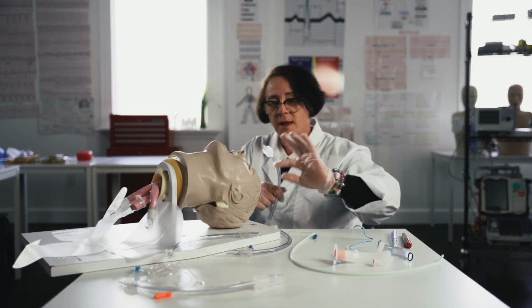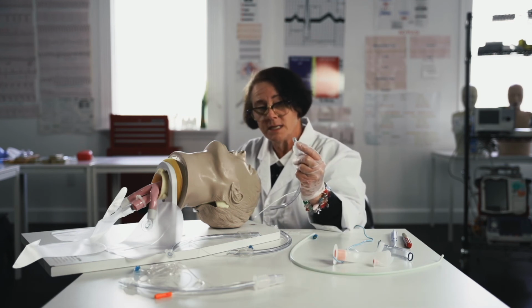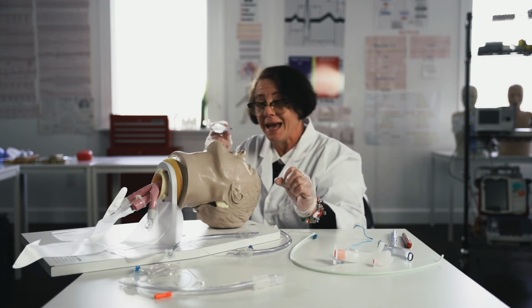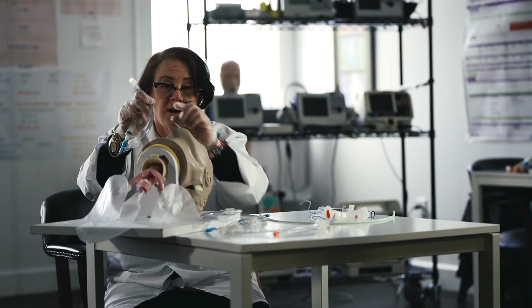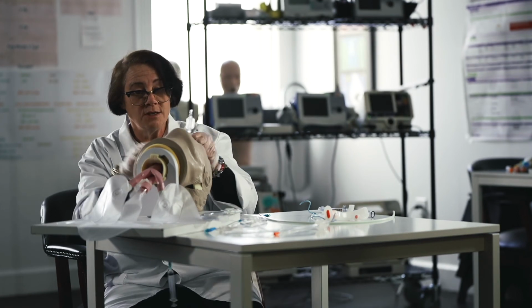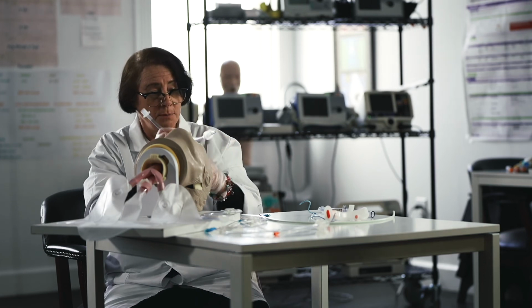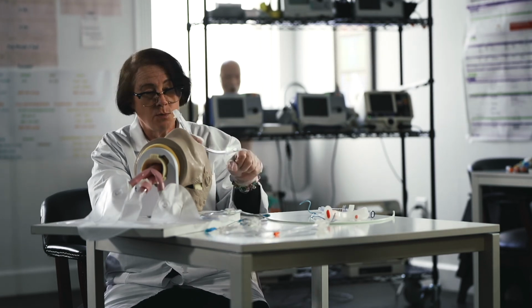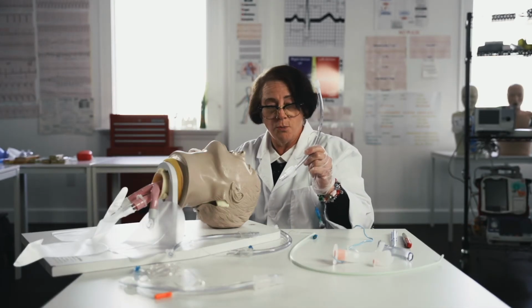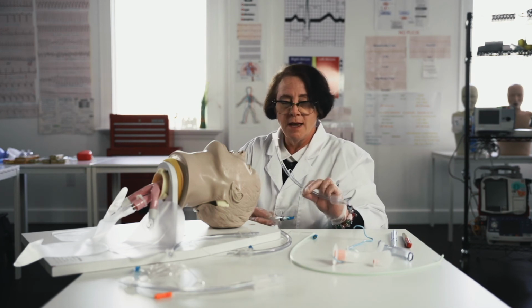Back to the oval of the eye. They'll not only use that as a landmark with the stylet, the Murphy's eye, if they do accidentally put the tube in too far and it favors the right mainstem bronchus, that little hole is going to ventilate the top lobe of that lung. So that little Murphy's eye has a lot of good purposes. It's a landmark for the stylet, as well as if they did accidentally intubate the right mainstem bronchus, that right top lobe would ventilate. When in doubt, take it out.